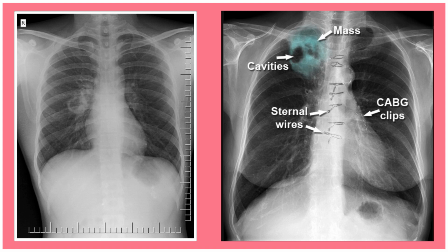And here we have some cases of lung cavities. As we see in the first image, a well-defined thick-walled cavity lesion noted in the right parahilar area in the right midzone of the right lung. And this is a case of pulmonary TB.